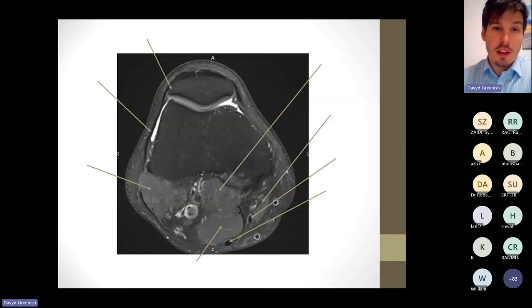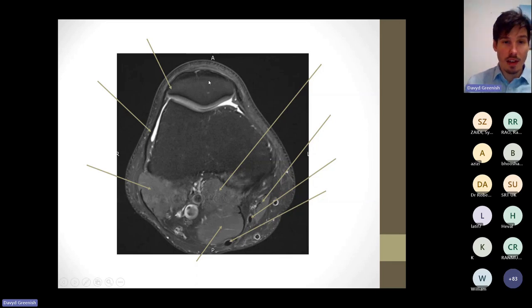So I was saying that the patella points laterally, but I'm not really convinced in this one that I could convince myself that's the case. I tried to choose a case where actually it's quite a symmetrical patella, so I don't think that helps us unlock it. But do people just want to say which structure this is here, which I've pointed to with an arrow?